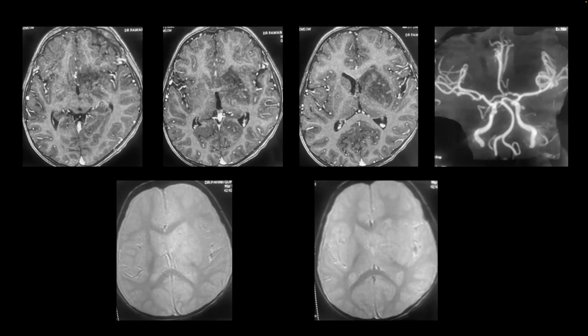These punctate things are all vessels, huh? There is some enhancement over there. Some linear enhancement is there, especially over here in these regions. These could be the lenticulostriate vessels, but possibly here there's some abnormal enhancement. Gauri's got a good point.